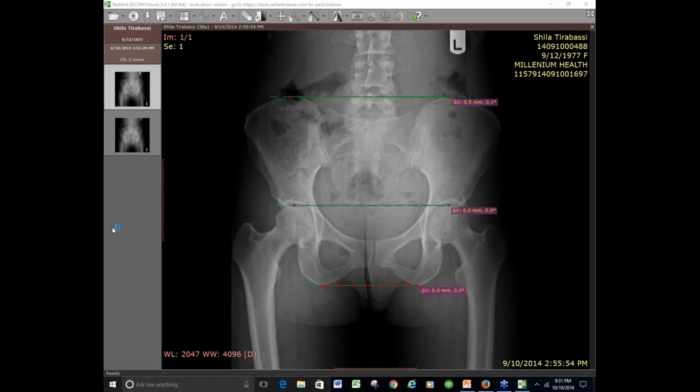All right, let me go back to Ed. Yeah, so let me ask you a question. Since we're going with the degrees, what if somebody has a fusion? Can you now put a lift in there?